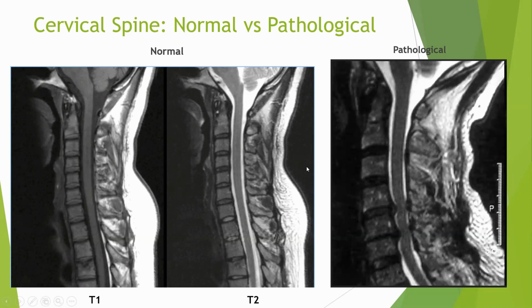And when there is water, it will be a little bit of a lighter shade, like this, like this, like this. See how light the shades are in T2. This is certainly T2 because the CSF is bright white color, right? Now you know this is T2. But notice one thing. Look at the IV disc. The IV discs are dark, which makes me feel that the IV discs, please note it down, if the intervertebral discs are darker color, that means there is less or loss of signal intensity.